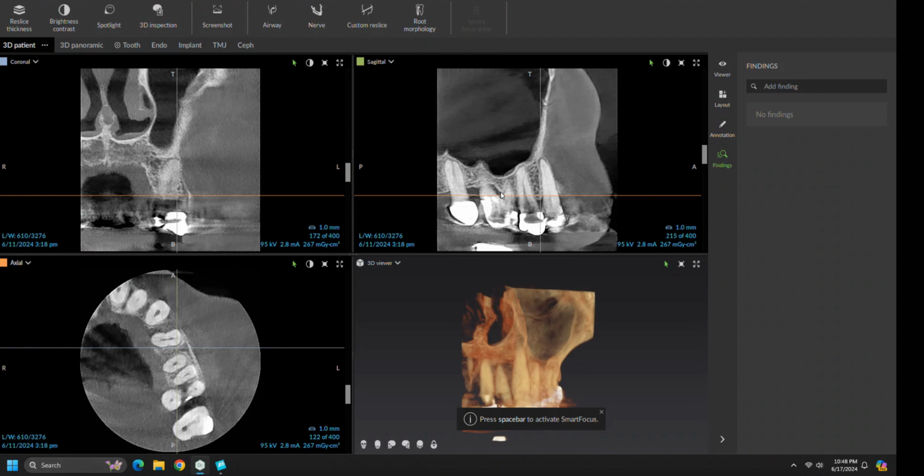Of interesting note, just the bone loss on the distal buccal root of number 14 and the furcation involvement. This speaks to me as a tooth that probably had some periodontal therapy in the past based on the flatness of the bony architecture. So my guess is this is actually a stable site, but with the CAT scan we often see things that are not very obvious on periapical or bitewing films. So bringing a little bit of attention to this area too might be of help for the patient.